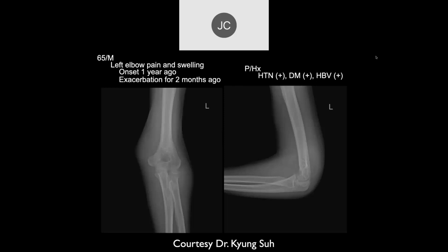Looks like there's a lot of soft tissue edema and swelling about the elbow, posteriorly and medially. Yeah, especially over here. Swelling, right. You don't really know if it's edema. You can say it's swelling, but I'm not sure you can say it's edema. Okay, so what do you want to look at? An MR.